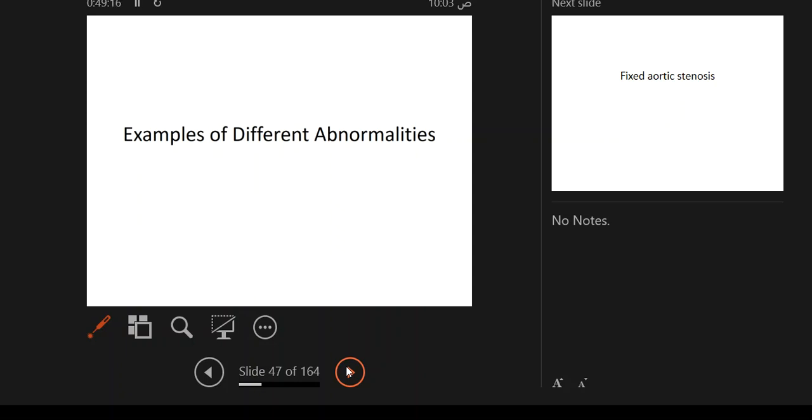So we see these things here. And they probably will have one of those times a congenital angio of some sort, whether it be Fallot or pulmonary stenosis or even an intervention, a balloon in the pulmonary artery, where really like a pulmonary artery being ballooned. So all of that could come as a tracing. But you should know these things.